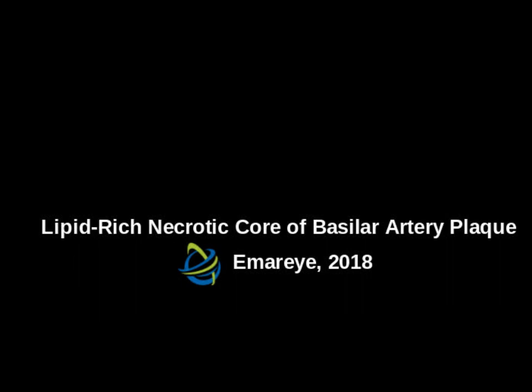The first image, A, is a basilar artery with multifocal yellowish arteriosclerotic plaque. The second image, B, shows the 3 layers of the plaque, the adventitia, fibrous cap, and the intervening lipid-rich necrotic core. The final image, C, is the histological finding of the lower arteriosclerotic plaque with intraplaque hemorrhage. The demographic data and plaque characteristics of the 95 patients are described in the following tables. Table 2 is the diffusion-weighted image findings of the plaque and measurement results of the plaque burden.